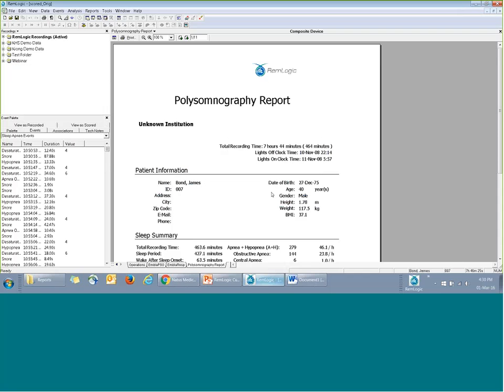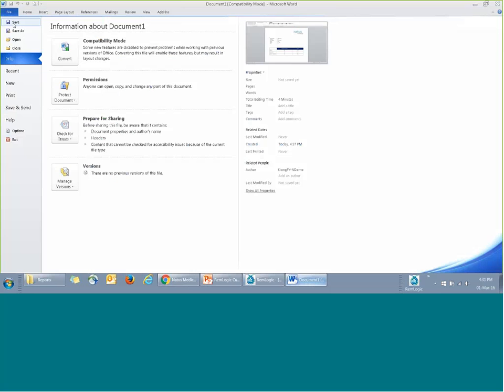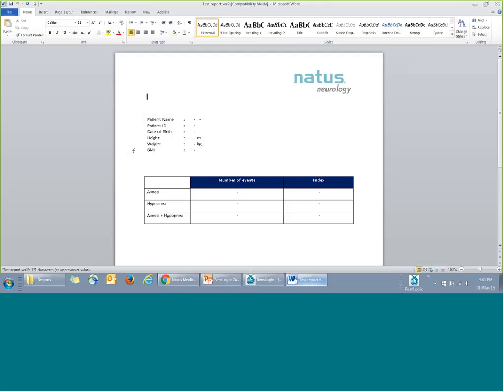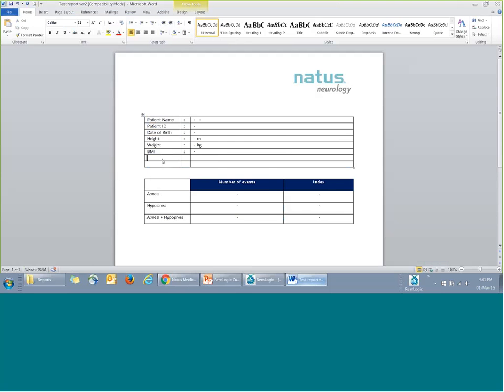So how do we get all this information into our report? I will show you here. Close it. I don't want to save anything. I'll open my custom report. Let's show everything here.